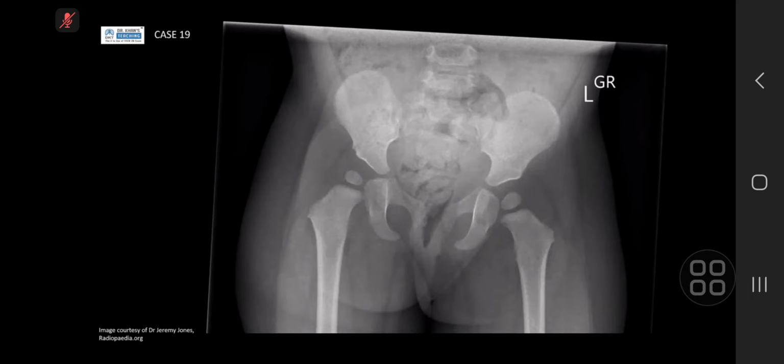This is a pelvis X-ray for a skeletally immature patient. Okay. What's the history? What is the patient complaining of? Altered gait. Okay. Was there a family history? Patient was firstborn, born in a breech presentation. Yes. Okay. I will check if there are any signs of DDH, hip dislocation.